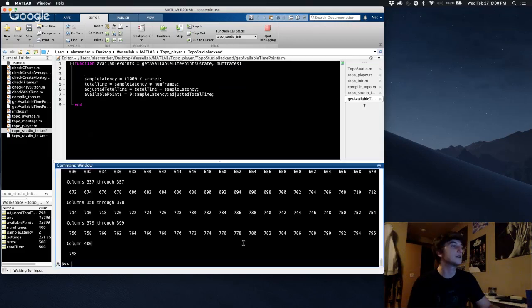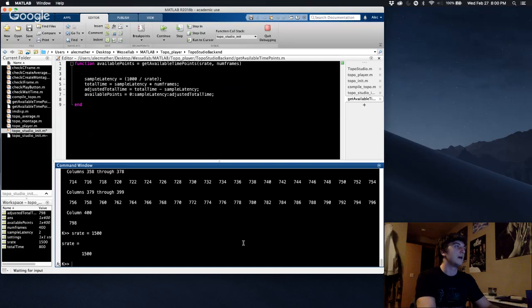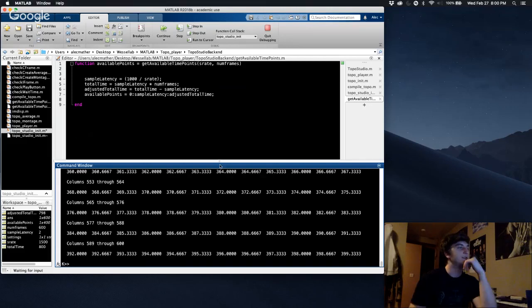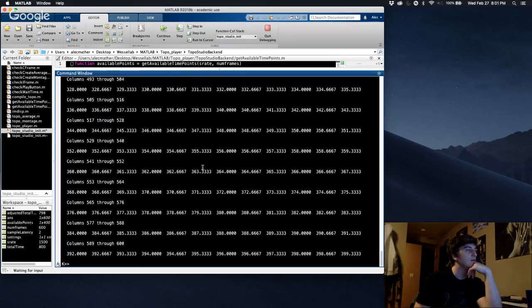So let's say that our sample rate is 1,500, and our num frames is going to be, I don't know, like 600. Okay, so let's just plug in get available time points, that's rate and num frames.